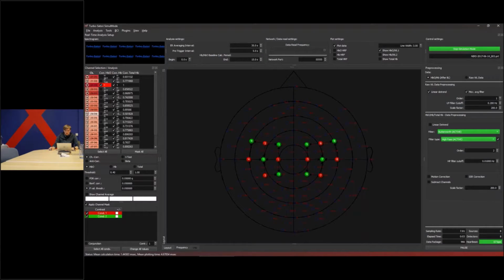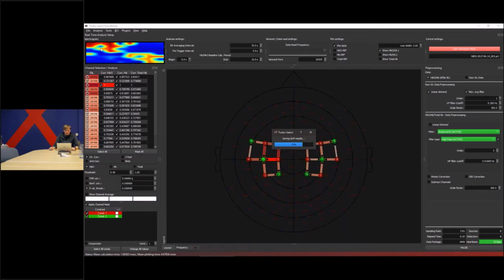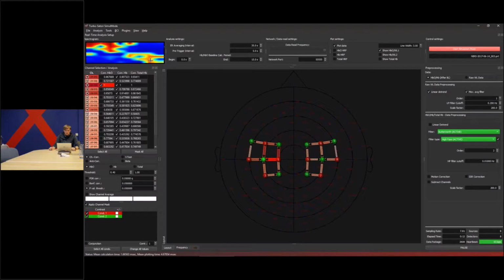You can just select these correlations, and then you will see here at the top that there is a clear pattern between the one hemisphere and the other hemisphere. But this is just a different view onto these data, allowing you to see the data without any thresholding, just looking at the signals themselves. So that you can see here the left-right is then shown in these patterns.